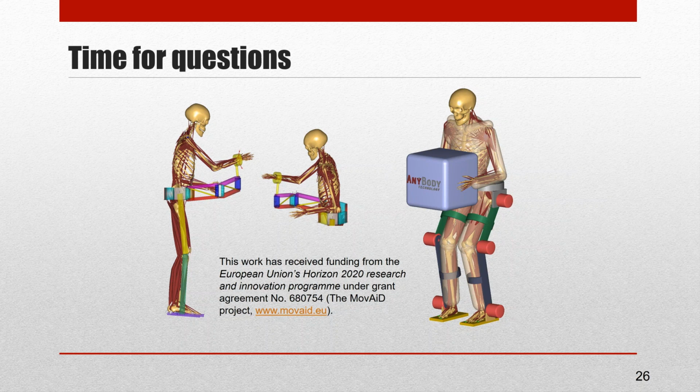So it depends a little bit on which situation we're talking about. Maybe you remember that we talked about two situations. One was where we had motion capture data available, and the other one was where we generated the motion on the fly using either kinematic constraints or keyframes. If we're using mocap data, I don't think that's what you're asking actually, but I just want to cover that as well. Then our mocap models have ways of putting the model close to where the mocap markers are. Sometimes it's necessary with a little bit of manual intervention to define the initial posture so that the body is close to the mocap markers. But after that, everything is automatic.